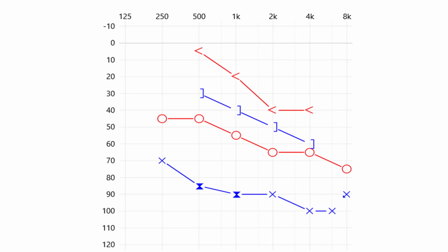How do we know that this shows a mixed hearing loss? Simple. Both the bone conduction in the left and the right ear are not normal. They're reduced. If we look at the right ear, the right less than symbols shown here show a sloping hearing loss. They're not in the normal range.